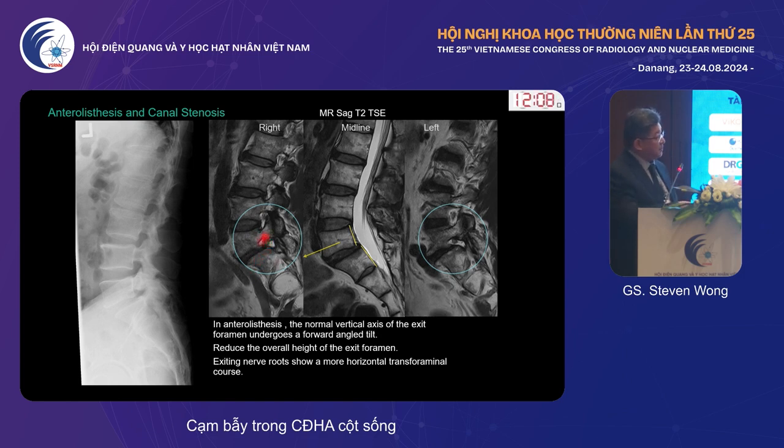And this means that your nerve root has a much more horizontal course over the exposed components of your intervertebral disc. And because we do our scans with the patient lying supine, you don't know the true degree of anterior listhesis or anterior subluxation. If the patient actually stands up, the subluxation may be worse, and the space available for the patient in the standing position may be even less.